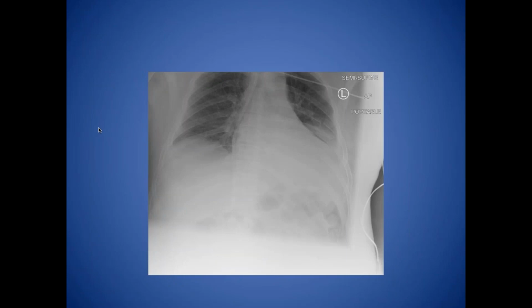There is another example where the nasogastric tube looks as if it might be in a dilated esophagus. If the patient was slightly rotated, you could argue that maybe it is in the esophagus, but I don't like the fact that the tube doesn't deviate to the left as it bisects the carina.